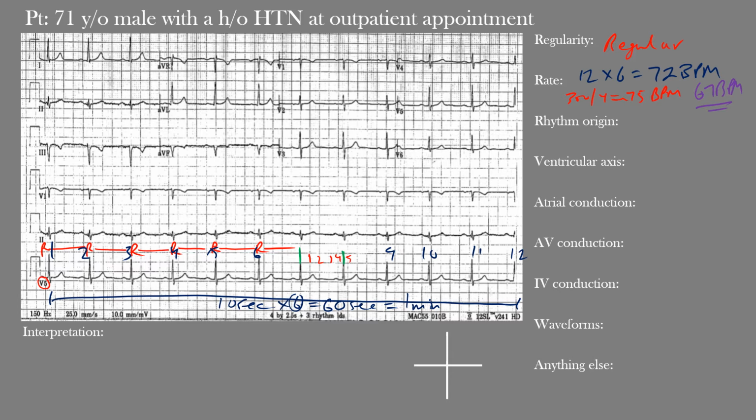Okay, so let's look at this. How do we know if we have sinus rhythm? Well, we have to look at our leads in which the sinus P waves would be directed. Remember, if we draw our heart here, this being our right atrium, our left atrium, our right ventricle, and left ventricle. Okay, and we have our sinus node up here in the upper right atrium near our superior vena cava. It has our internodal pathways that come to our AV node. Then we have the His bundle, it splits into right bundle branch. Then the left bundle branch splits off into a left anterior and posterior fascicles, and both these sides end with these ventricular Purkinje fibers that innervate the cardiomyocytes.